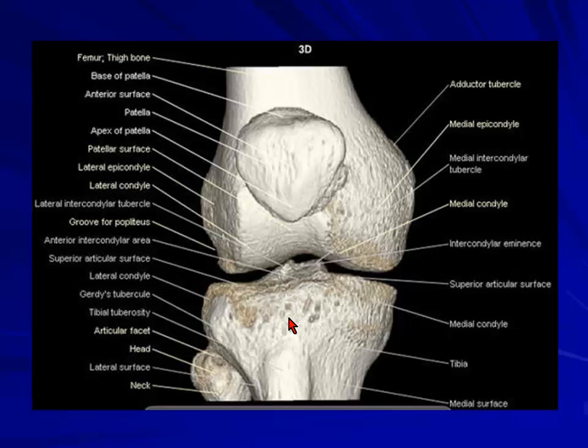The important thing is why I want to show this. Basically, for you to be able to identify, define and localize the abnormality when you see it on SPECT CT. So you need to put in your report the exact anatomy of a bone. So you're looking at the patella. The patella is external, and the internal is the cartilaginous part, which articulates with the trochlea of the femur.